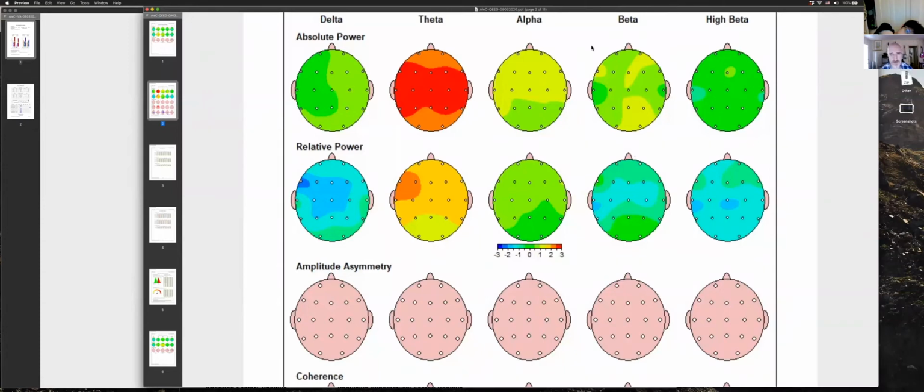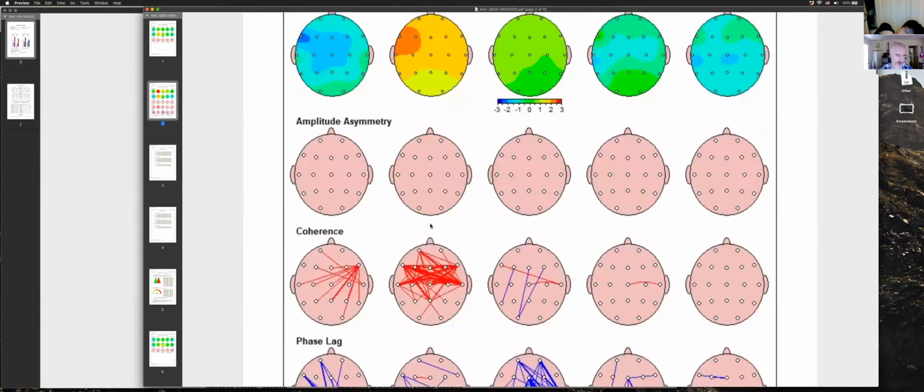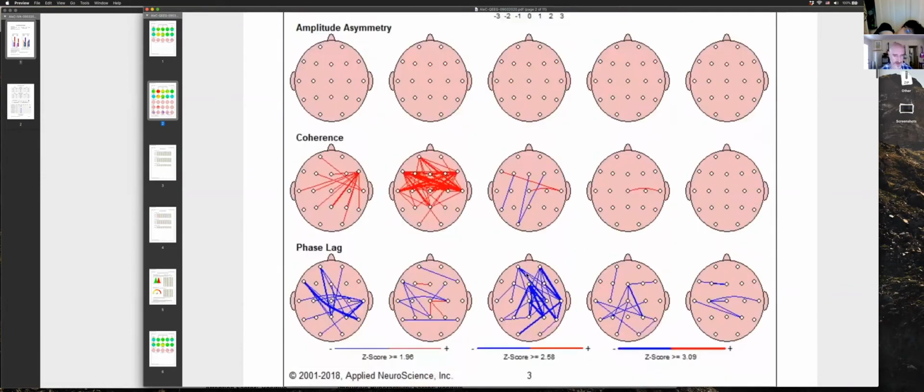But I would say the most important thing is these anterior cingulate, posterior cingulate, those default mode networks. Those are the biggest feature in some ways because you're seeing it there as well and there as well.